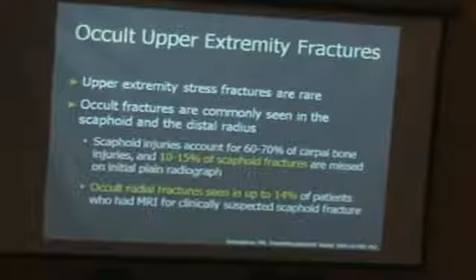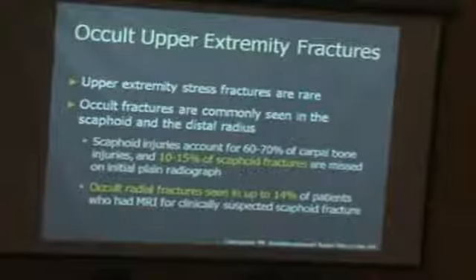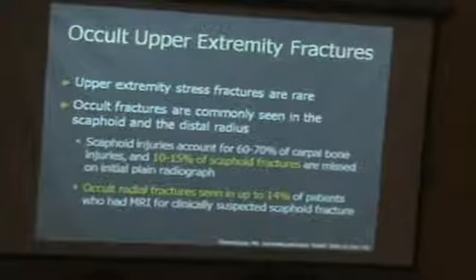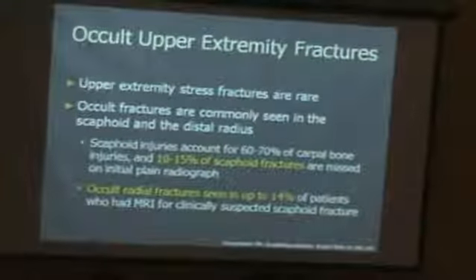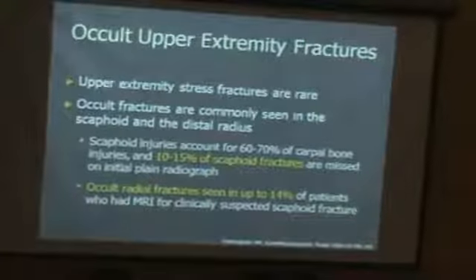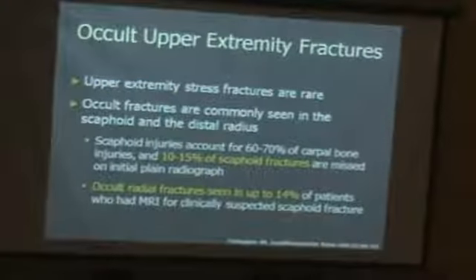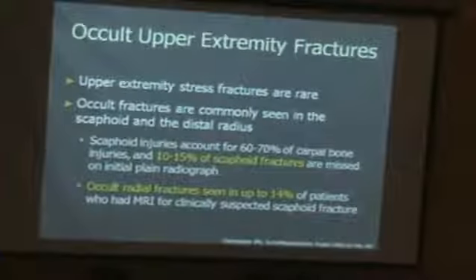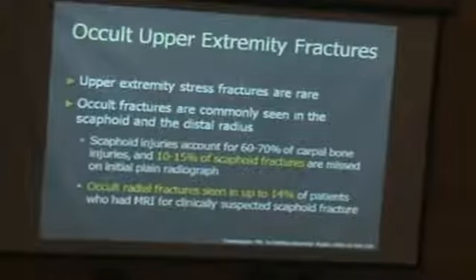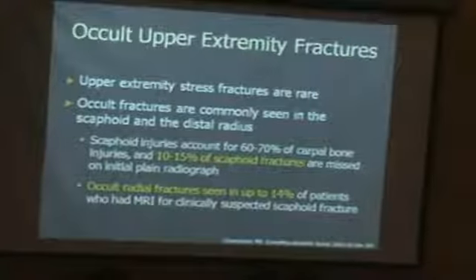If you wait one week, and especially if you have a mid-scaphoid fracture, you're going to have an osteonecrosis of the bone, and then it's completely useless to intervene at that point, because what you're going to have is, of course, a carpal dislocation, and you're going to end up with the patient having a carpal fusion because you cannot do anything. Pain will always be there. So make sure that you really think about the scaphoid fracture. If you don't have anything on X-ray, the patient is very painful, and there is high suspicion of fracture, go to the next step, MRI.